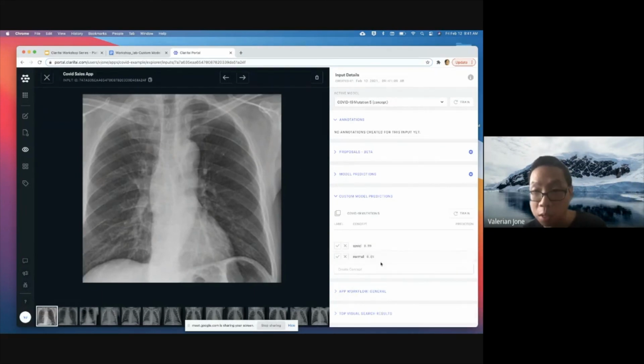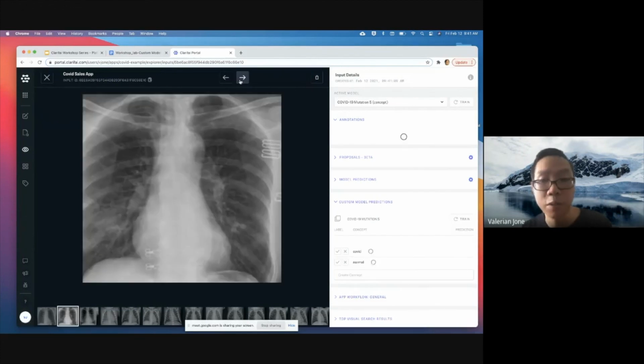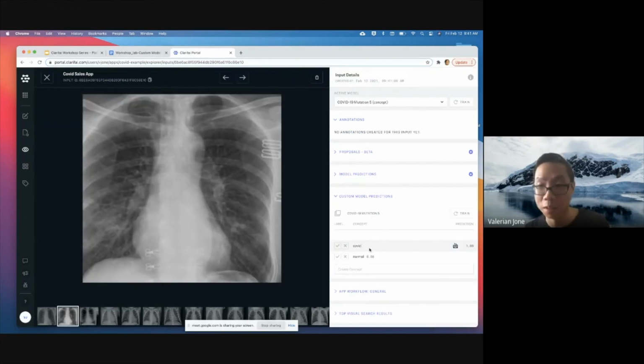And we can see here, hey, this has COVID, at 99% confidence rate, right? Let's look at another image real quick. This one thinks it's almost 100%. Technically, it's probably a little bit less than that. It's just rounding up due to the UI. But again, this actually was able to determine that this had COVID, and apparently the doctor left some scissors in their abdomen too.